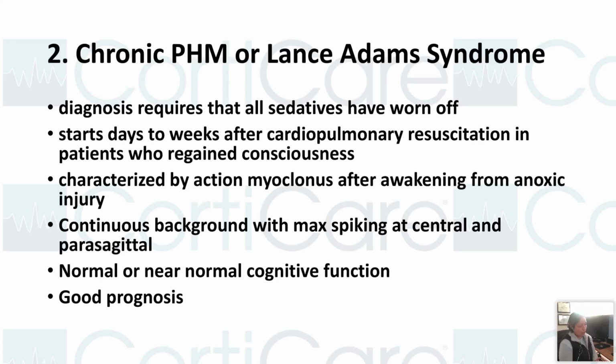Patients have regained consciousness, they are off sedation, they have woken up from their anoxic injury, but there is still myoclonus, there is still jerking of the muscles happening. The background is continuous, and we are still seeing discharges, and those are sharps and spikes. Those discharges are maximally focused at central or parasagittal region. Patient will have normal or near normal cognitive functions. So it means the prognosis is good.